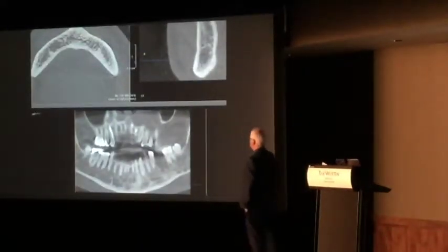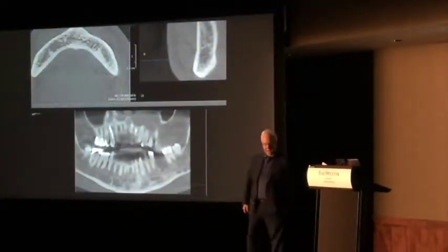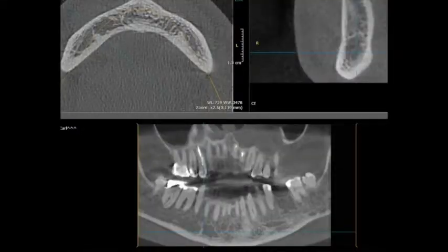And the sad news is, I don't think it was anything. You know, it could have been a traumatic bone cyst. It could have been an osteoporotic bone marrow defect. I don't know why no surgery's been done in there. You know, if there is a history of trauma or something that might lead you to that other diagnosis, it could be.